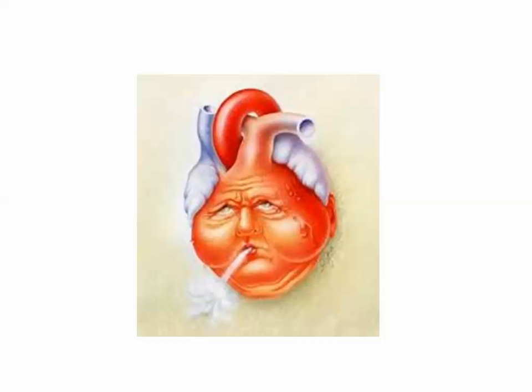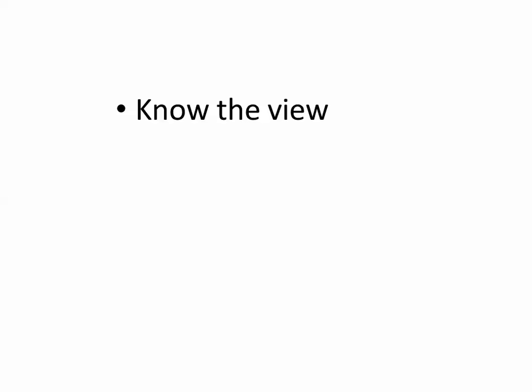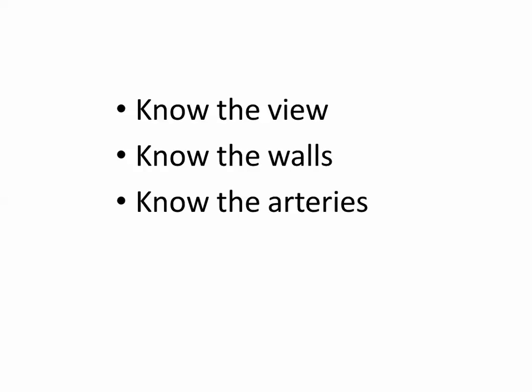Clear or not? If not clear, he will be sad. So first know the view, as we said, it's RAO or LAO. Okay? And how do you know that? Then know the wall. Once you know the wall, you will know which artery will supply it.